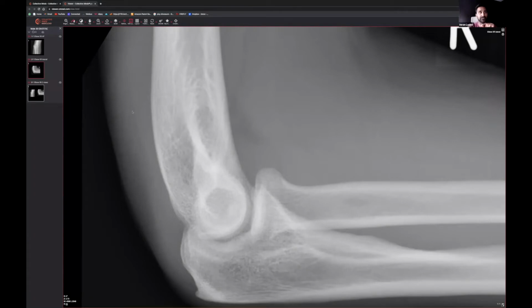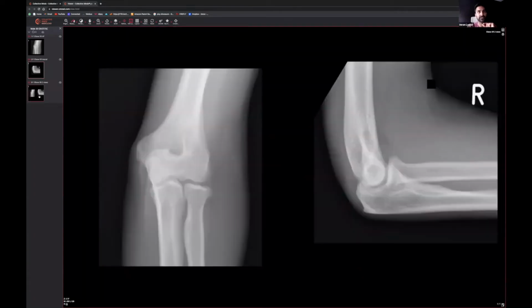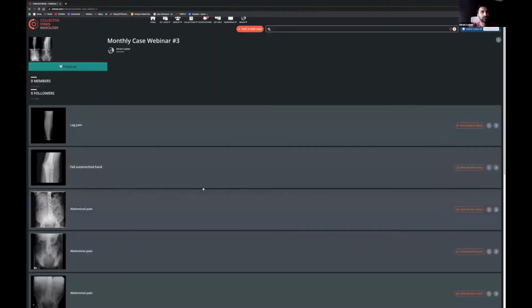But in this particular occasion, we don't have a second fracture. What we have is only the primary fracture sitting over here, which is going to be that radial head. Right, and obviously we've got that joint effusion as well.